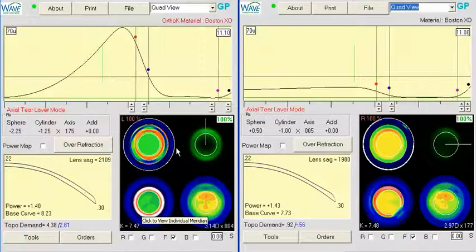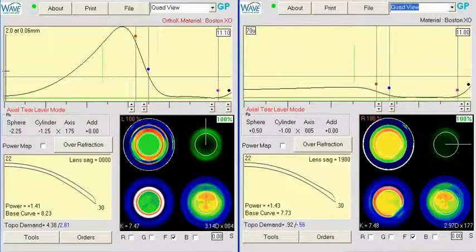I think there is also a question about whether there's too much sag. I don't know what the post-wear topographies look like or exactly how the lens was fitting on the eye. There is a little bit of clearance here, 0.8. It's not a bad idea to have good seal-offs on the periphery, so sometimes what I'll do is click down until we get around 2, maybe 3 microns of clearance, just to make sure that the edge of the lens is really settling down on the mid-periphery of the cornea and forming a good seal.